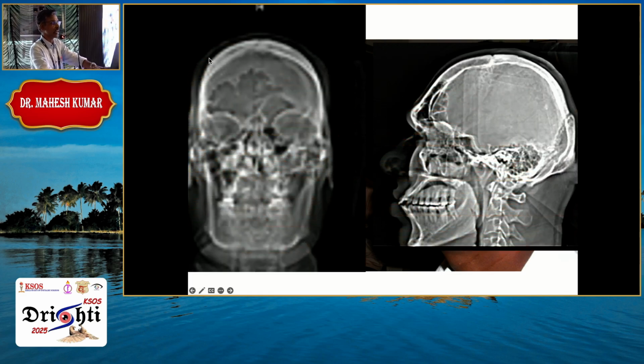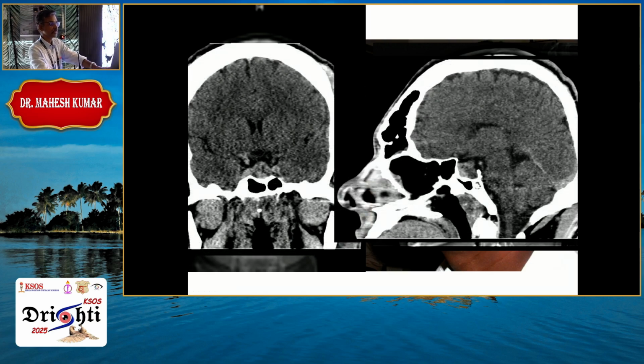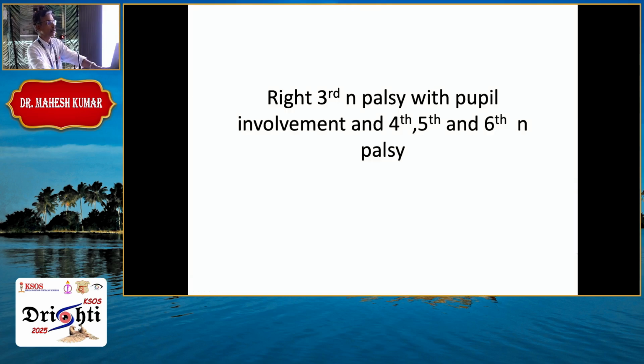So, you can see the hypertrophied frontal sinuses and large cellular area, double flooring of the sella. And after tumor excision, you can see the chiasma, some residual mass is there. Usually they give radiotherapy. So that's a growth hormone-secreting tumor.